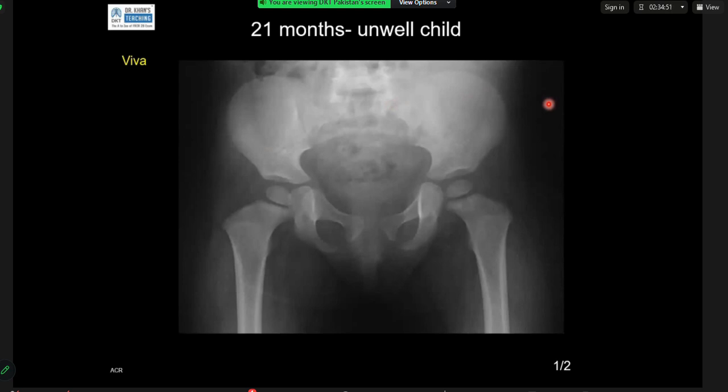I do not see an abnormality with the ilium bones bilaterally. To conclude, I believe the main abnormality is a lucency in the left proximal femur with cortical periosteal reaction of the medial margin. There's no soft tissue component.